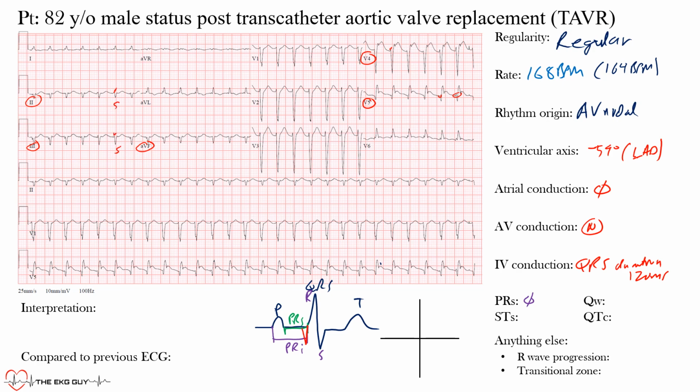And again, so not really true Q waves. Maybe here, all right, it's hard to truly tell that there's some there. So there may be some Q waves in the inferior leads, so we can write inferior, and possibly the lateral precordial leads. Now it may represent that there's something acutely going on and the Q waves have not formed yet, all right? And that's one thing to keep in mind.